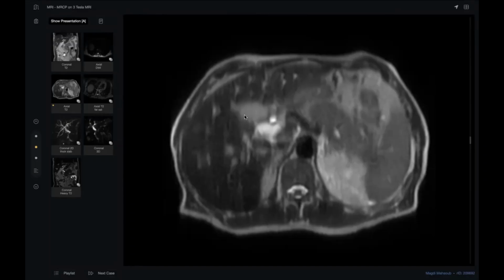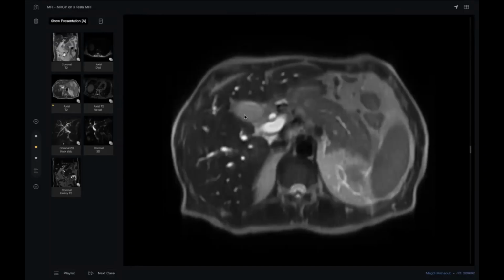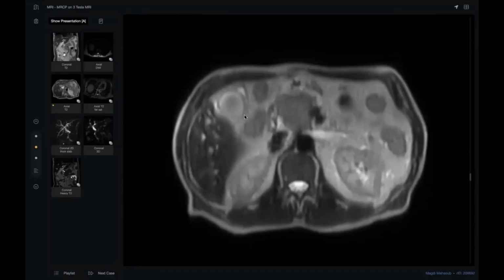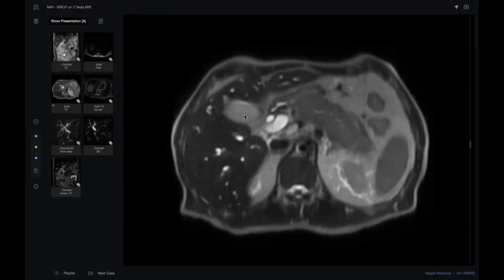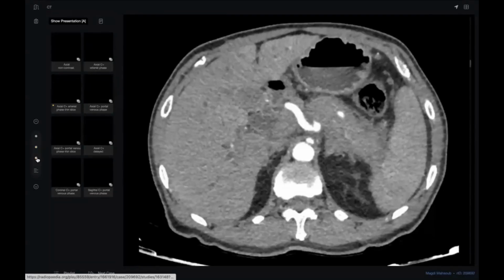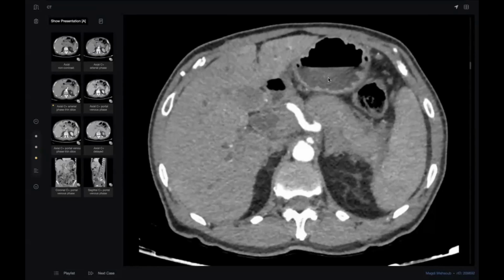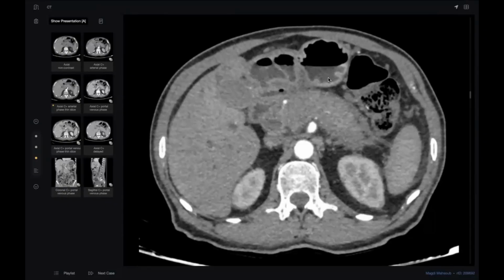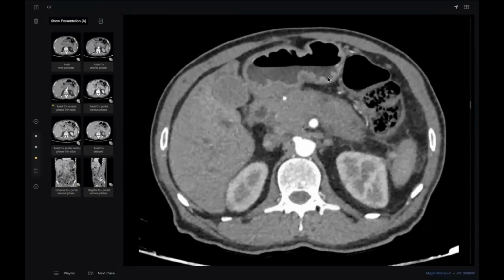Retroperitoneal fibrosis. Yes, these are a spectrum. We are searching for retroperitoneal fibrosis. What else? IgG4. What do you mean by IgG4? See, this is a pancreas. IgG4-related diseases include fibrosing mediastinitis.